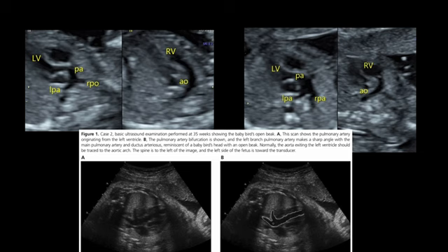Now we are going to see the various signs that have been described to increase the detection of this condition. We know that one of the characteristic features of identifying great vessels in fetal echocardiography is by looking at the bifurcation. Any vessel that shows bifurcation is generally perceived to be the pulmonary artery, and usually this is the first clue. So having that in mind, if you look at the outflow tract that is arising from the left ventricle, you can see that it is bifurcating, and what is described here is the bird's beak sign.